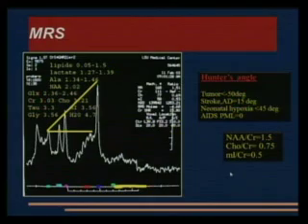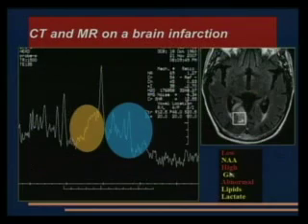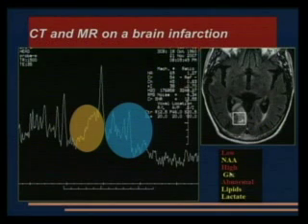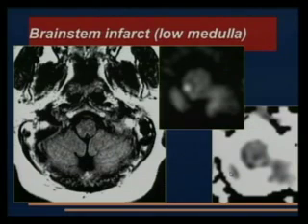And we don't practically use MRS. In MRS, there is an increase in glutamate, there is lactate in here, and the other peaks are normal or decreased. You see that the NAA is decreased because there is loss of neurons, and the choline and the myoinositol are almost normal. Remember that there are infarcts in the brainstem, you see.